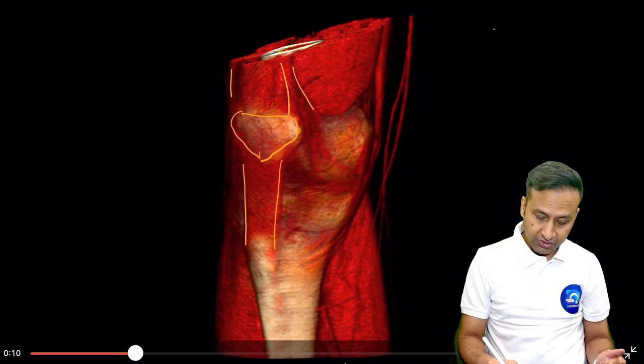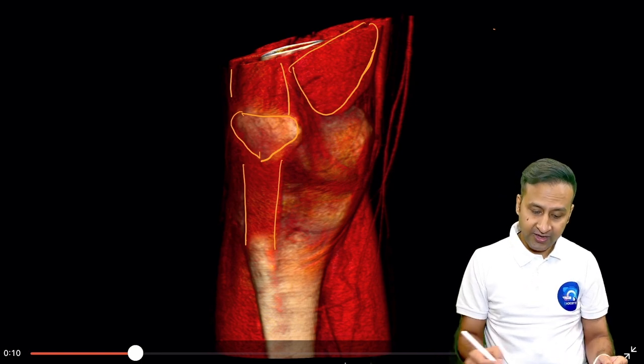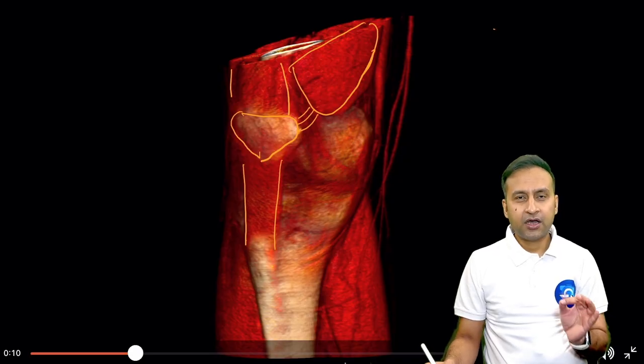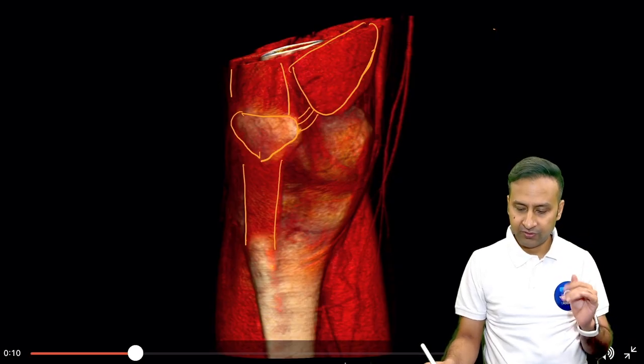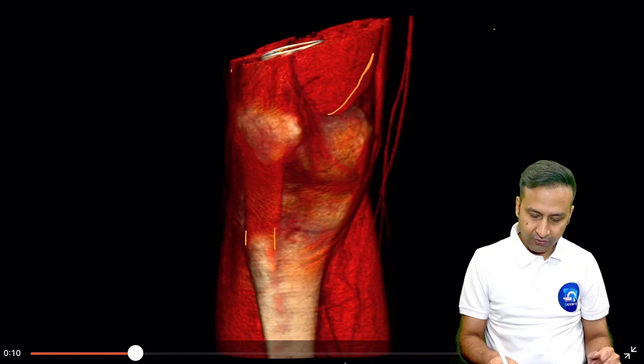I can also see a very big fleshy muscle along the medial aspect of the lower thigh, which is attaching somehow to the patella. These are the two basic muscles that I can see when I'm looking at the projection of knee from the anteromedial view. Right? I hope everybody of you would be able to appreciate all of them. Now, let's look at the video further.